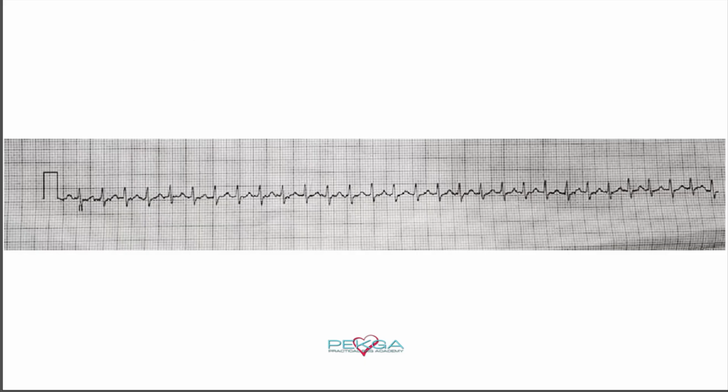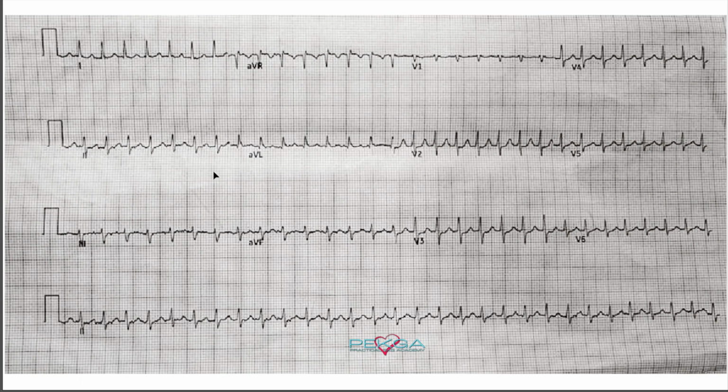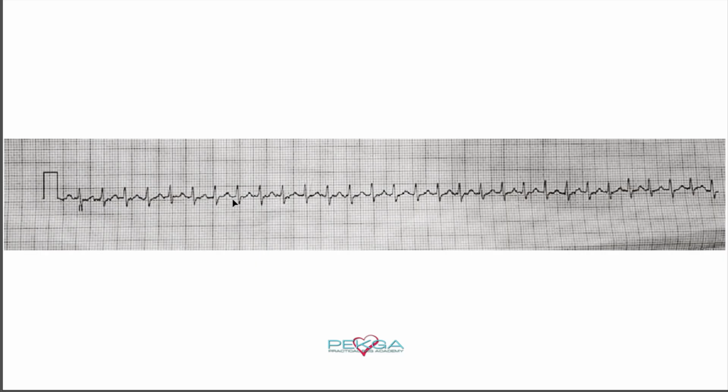Today, we're going to be taking a look at this 12 lead ECG of this apparently very fast rhythm. We are going to be breaking it down starting with a single channel. We're not going to be going into 3 channels today. That simply was not presented on this ECG. So let's get into it.